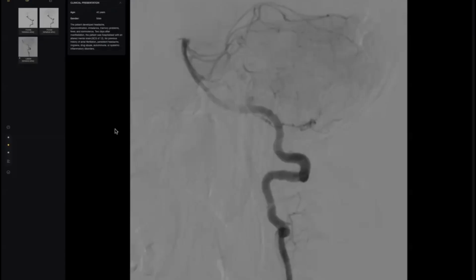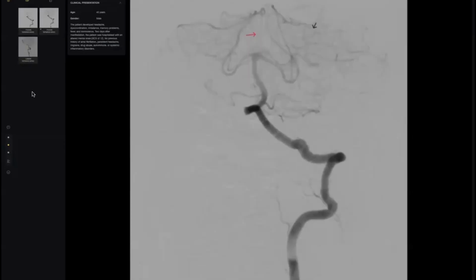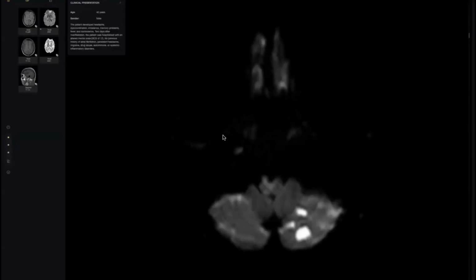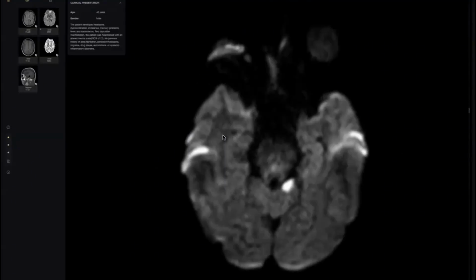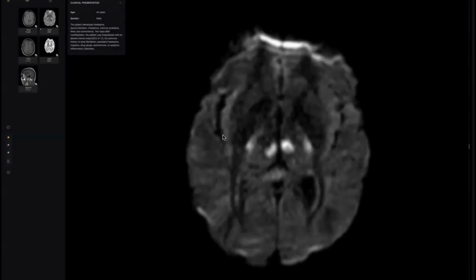Okay, my colleagues, so it is a case of vasculitis with artery of Percheron involvement. Why? Because of the bilateral symmetrical medial thalami affection, medial thalami stroke. Even our colleague told me this is occlusion. Okay, no problem, basilar artery occlusion, no problem. But he is on the correct pathway. Thank you, doctor. You did very, very well. Next candidate.